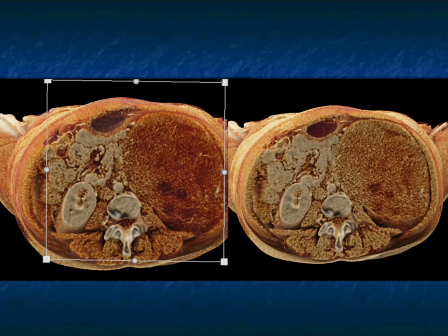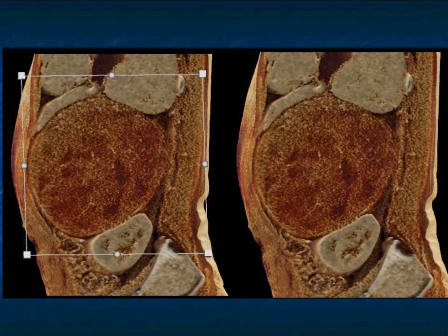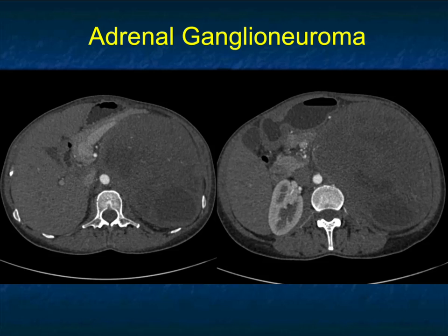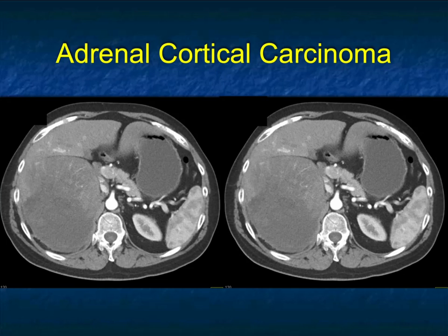The cinematics shows it's cystic and solid with mottled attenuation as well. Very nicely shown here on the cinematic also. You see the stretching of the vessels from the celiac to the SMA, just how the tumor fits in there. And this was a ganglioneuroma. Now, I would have said an ACC, though it wasn't very vascular. Metastasis is almost too big for a met. Some type of crazy angiosarcoma. We've seen a few of those in the adrenal glands. But this was so large. But this was a ganglioneuroma. Ganglioneuromas are uncommon tumors. They're usually relatively hypovascular, but they're usually not going to be this large.